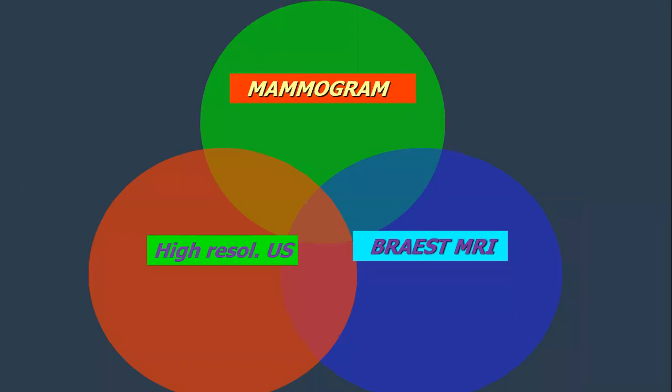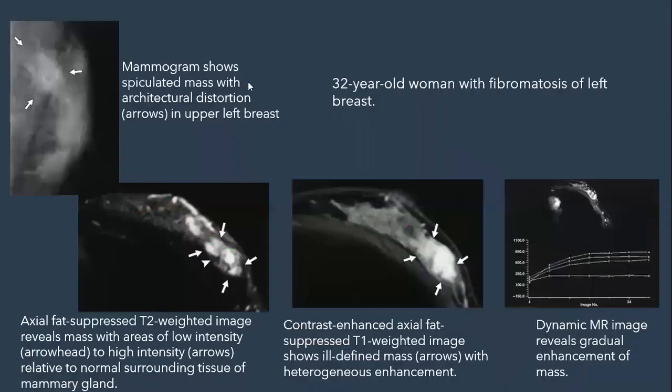Okay. So here we have these indistinct lesions, same on MRI here, and enhancement in a 32-year-old lady in a case of fibromatosis, left breast fibromatosis. This is the fibromatosis. If I ask you to ask me one question regarding this lady, what would you like to ask?